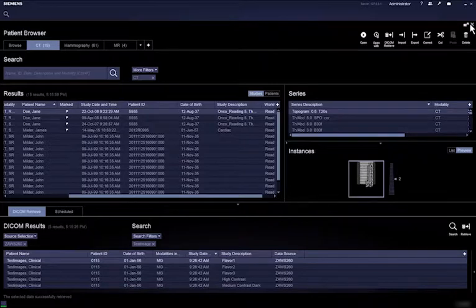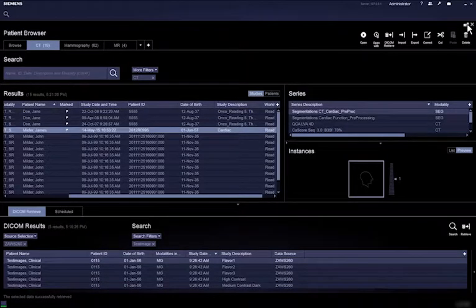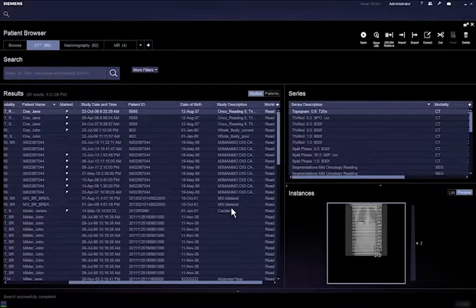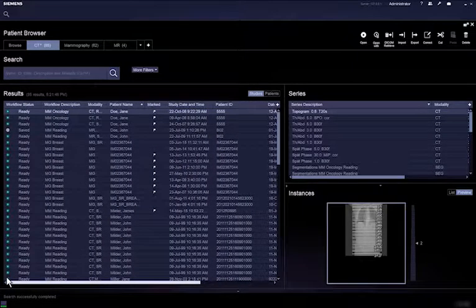In Syngo VIA, the different advanced applications are called workflows, as they are designed to guide you through the clinical assessment, performing certain image pre-processing tasks for saving time and helping in your daily routine. The workflow assignment rules are configured in the Administrator portal.